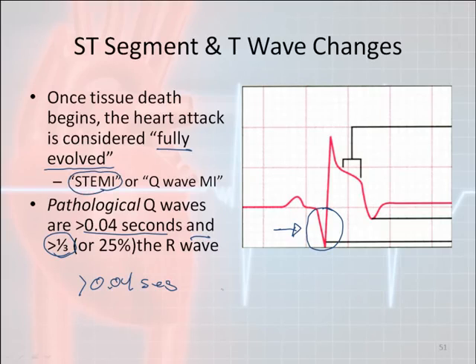If you look at the previous EKGs or the previous QRSs that I was showing you, you will have a cute petite little Q wave and the QRS and then a T wave. It's kind of hard to draw that. This right here tells me that it is ischemic. This tells me that it's infarcted. This is not uncommonly called a STEMI.